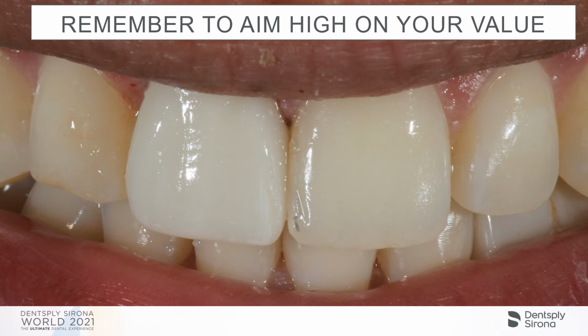So here, this is a block that I fired without putting any color on it whatsoever. And let's go ahead and turn this into a black and white image. You can see we took a tooth that had a very low value initially compared to the surrounding dentition, and now we have a high value tooth. This is absolutely excellent, because what did I tell you about matching colors earlier? Whenever we're adding any sort of stain or glaze, we have a tendency to lower our value.